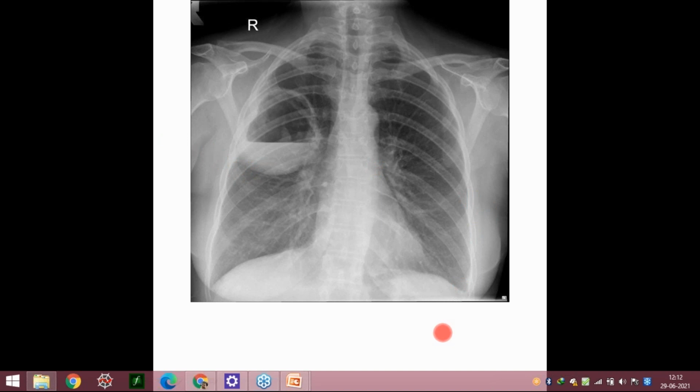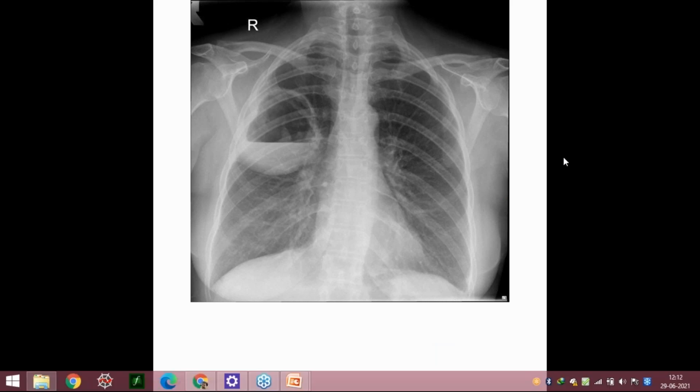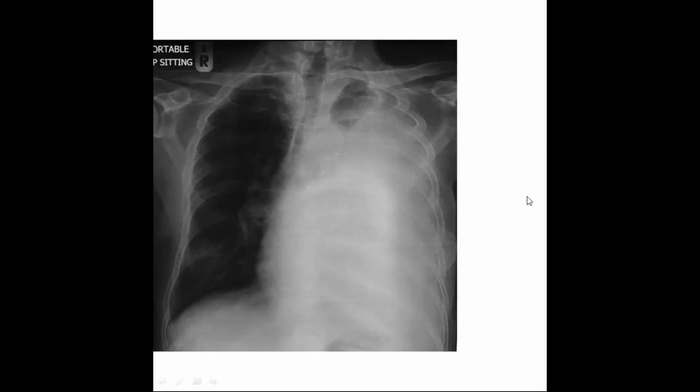Okay, so we move on to next. Okay, so now we come on to this X-ray. First, what about airway?